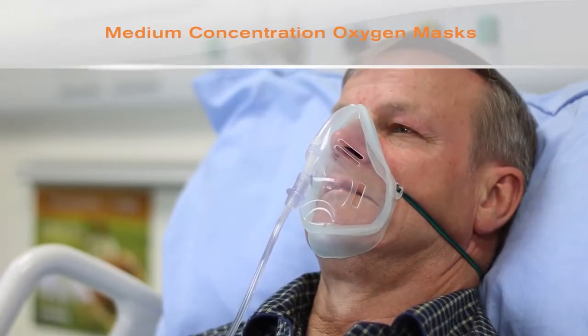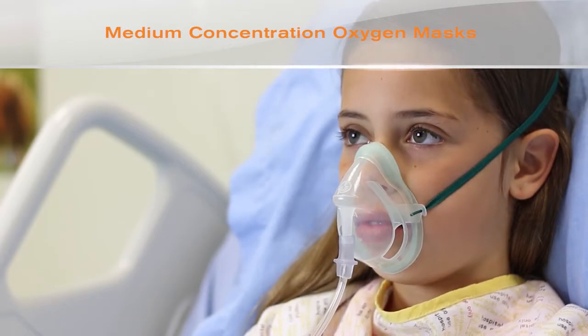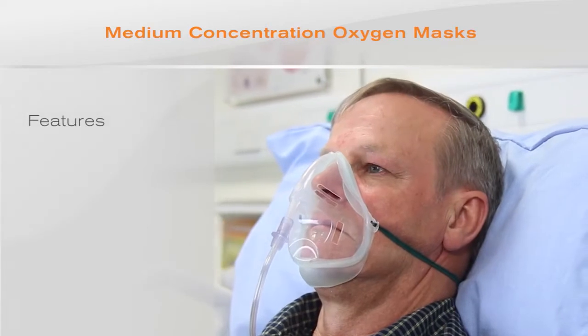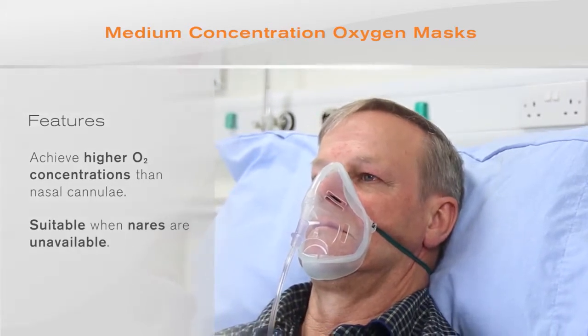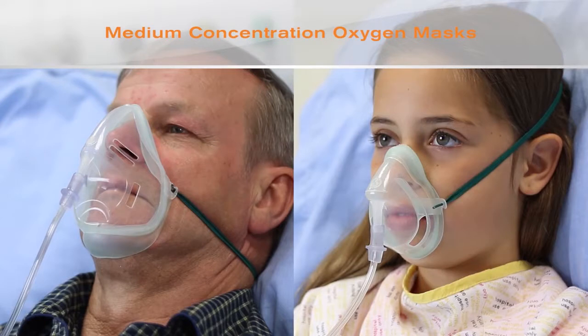Now we can look at medium concentration oxygen masks, which provide another option for the delivery of low-flow oxygen therapy. These may be used for concentrations higher than those that can be achieved with nasal cannula or when the nares are unavailable. These masks are available in adult and paediatric sizes.